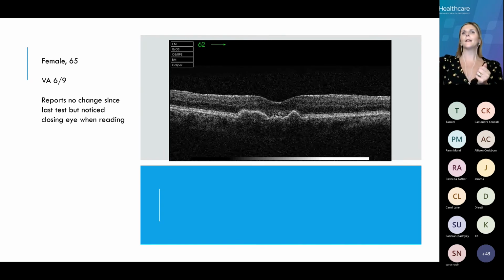So when we're looking at this B scan, obviously now what's different is we're going to start to see maybe different contrast, different images that we're looking at. Also important to note, when you're looking at your B scan images, obviously I said about your scan quality. Scan quality will always normally be on a B scan, but also so will your scan slice number. So just making sure you understand which one's a scan slice number and which one is the image quality.